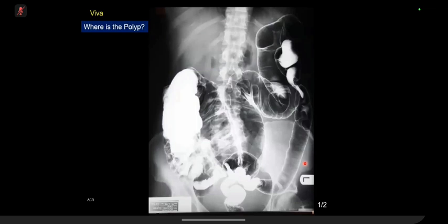I will show you another one if you raise the issue. It's in there, towards the right side down. Yes, this is the polyp. Okay, can you name names? So is it in the descending colon? In the descending colon low part, rectosigmoid, sigmoid low part.